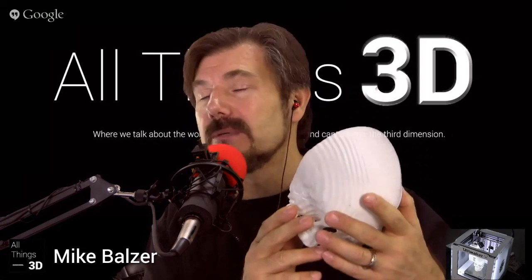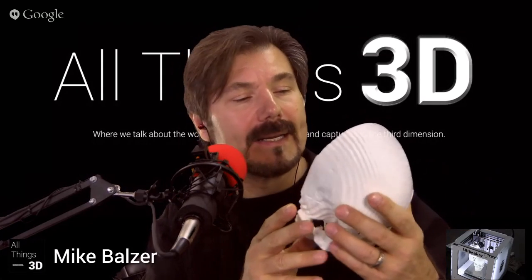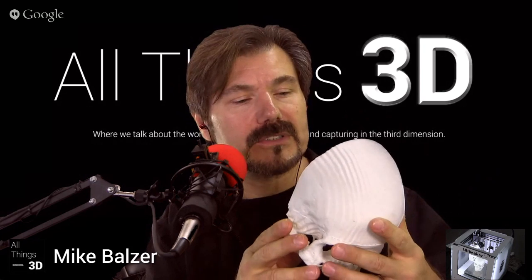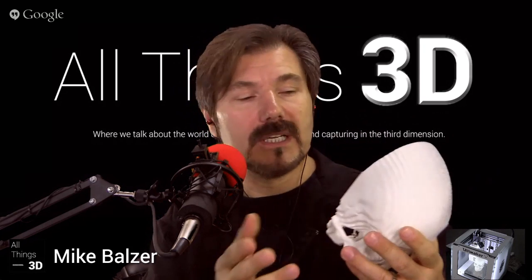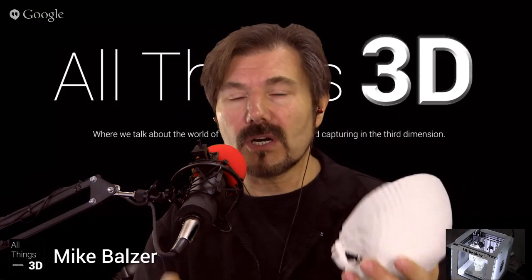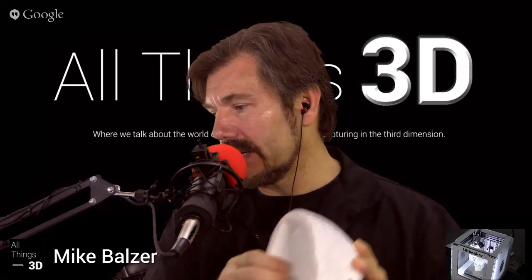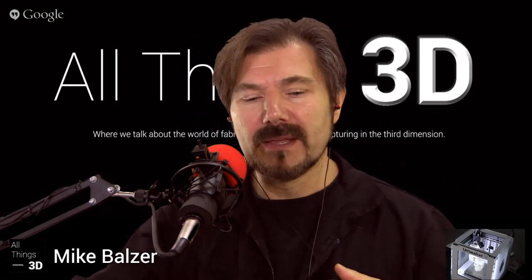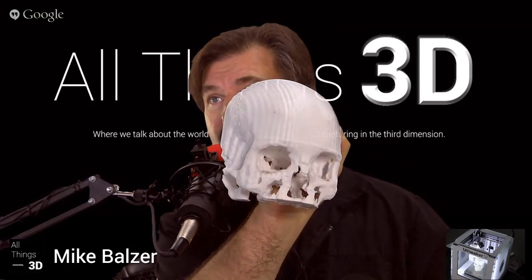But I also thought it would be important to send it to our surgeon. And what he told me was that it was great for planning, and they could see it because UPMC is also an educational school. The ability to use these for educational purposes, using real live current data instead of historical data. So they see a lot of power in this. In fact, one of the fellows for Dr. Gardner was really excited.